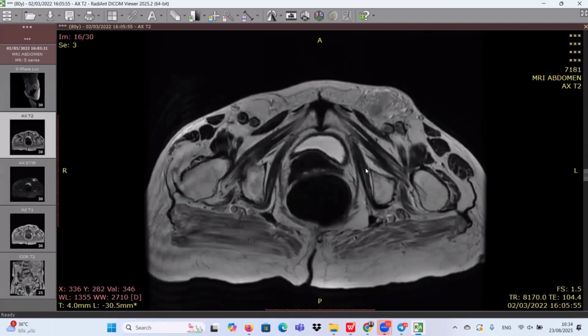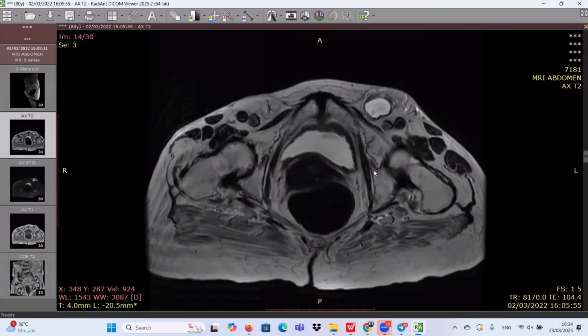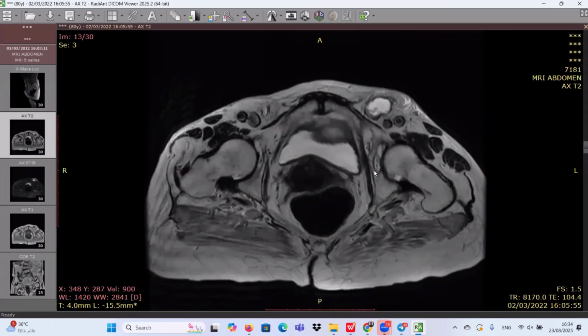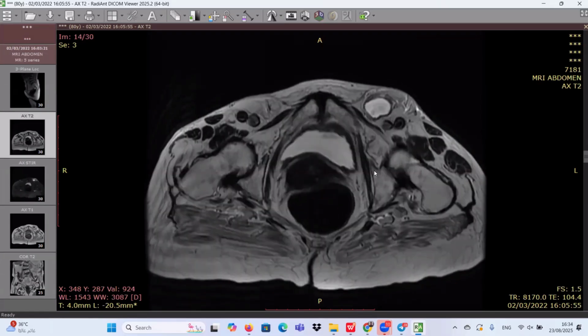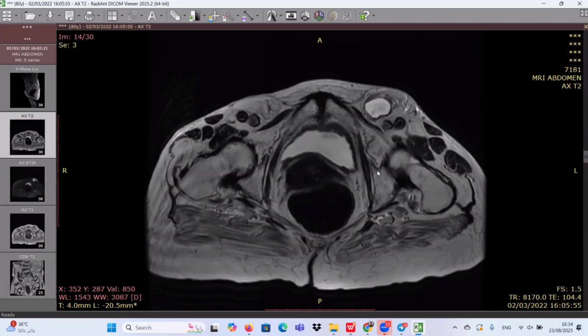So okay, let's conclude, or let me ask you the most important question here. Which type of hernia is this one? We have a left groin hernia. Is it inguinal? Is it something else? What do you think? I think it's inguinal. Inguinal hernia. Okay. I'm happy, because I think you got the diagnosis, but I would like to modify some points.